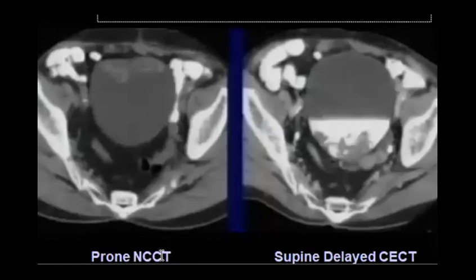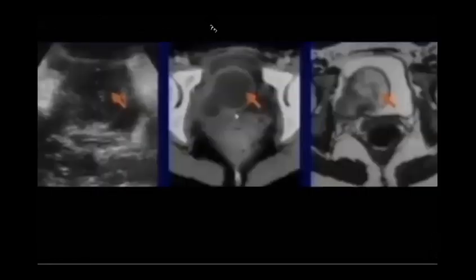So this one was non-contrast, as you see. Then this patient was in a supine position, and then he has this appearance. So what is your differential? Perfect, Ala. So what happened? Because it changed location. Changing location means that it is blood. So it is one of the good differentials to put. It will be hematoma. Nice.